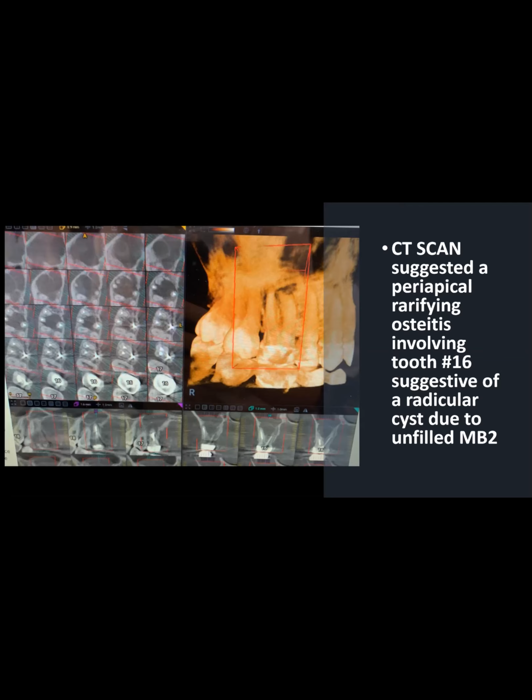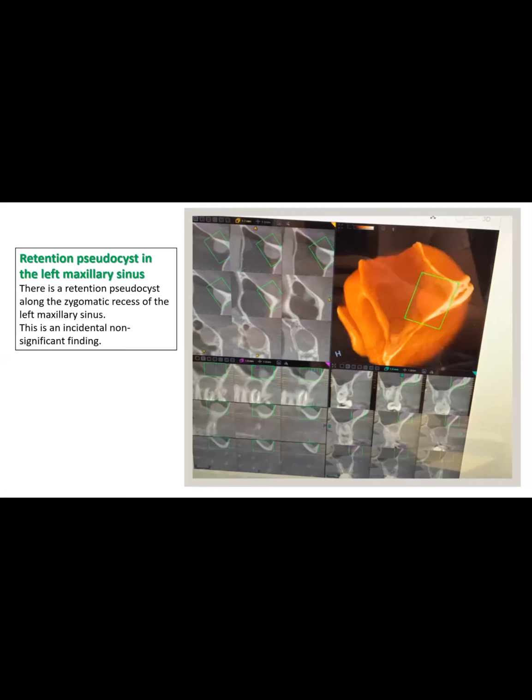And Dr. Sally, can we see the other CT scan, please? Well, that's an incidental finding of a retention pseudocyst. That's just an incidental finding. And look how big that one is. So, lucky enough, on tooth number 26.